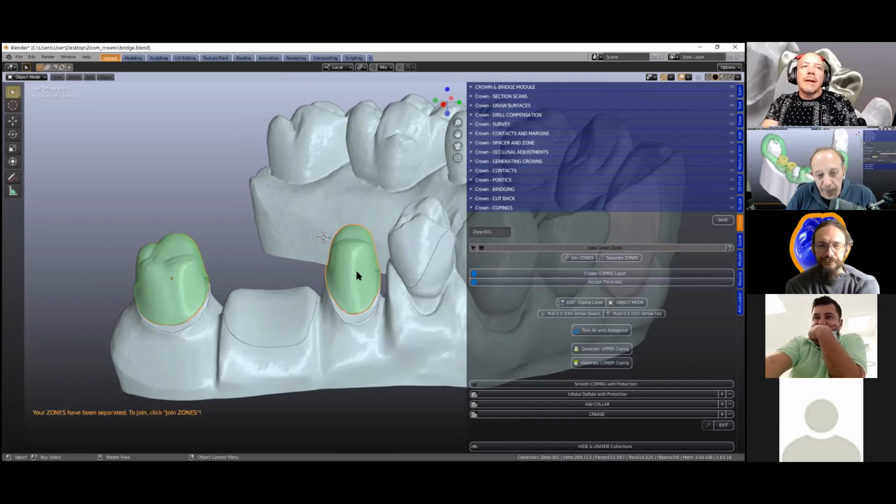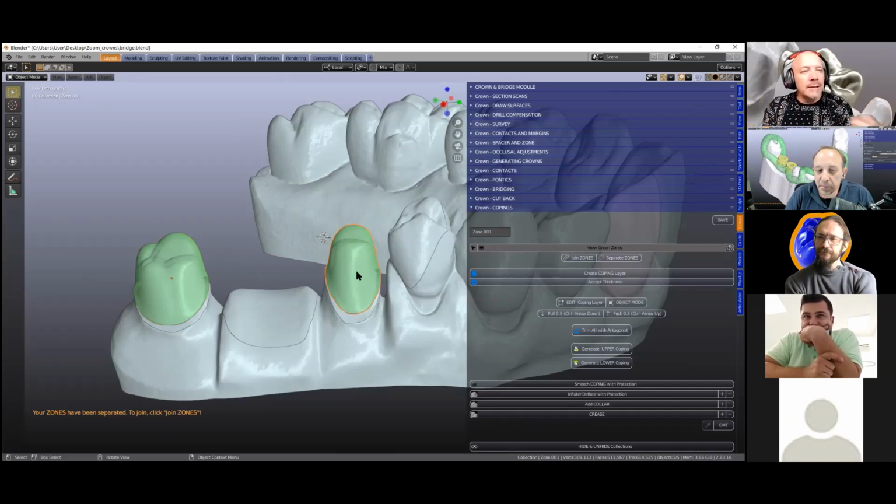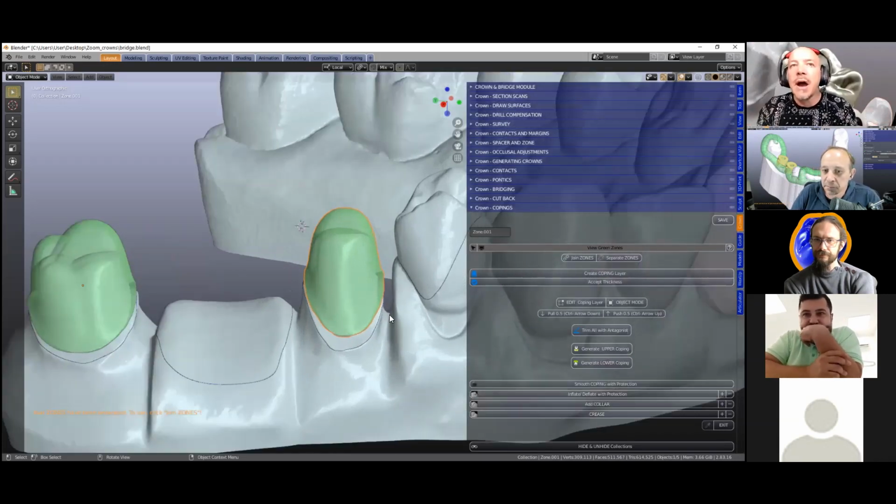Now this is very good, because in a front tooth, for example, we've made a front tooth and the shape is not right. Okay, patient comes back, it doesn't look right, you know how they are, front tooth. And you've picked a tooth library and it didn't work for you, so you're going to cut off the other central to mirror image it. And so you don't want to do the whole thing again. So here we've called up the project and we are back at the midway mark, which is absolutely fantastic, because I can put another tooth library here and then make a new crown, which is fantastic.